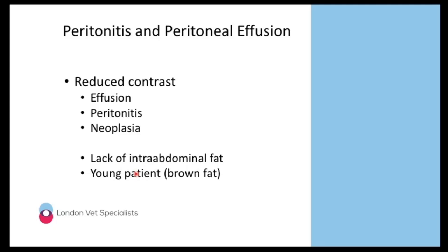Other than that, if you are looking at an abdominal radiograph and you're really struggling to see any of the organs, then you certainly need to consider the presence of a peritoneal effusion and or a peritonitis.